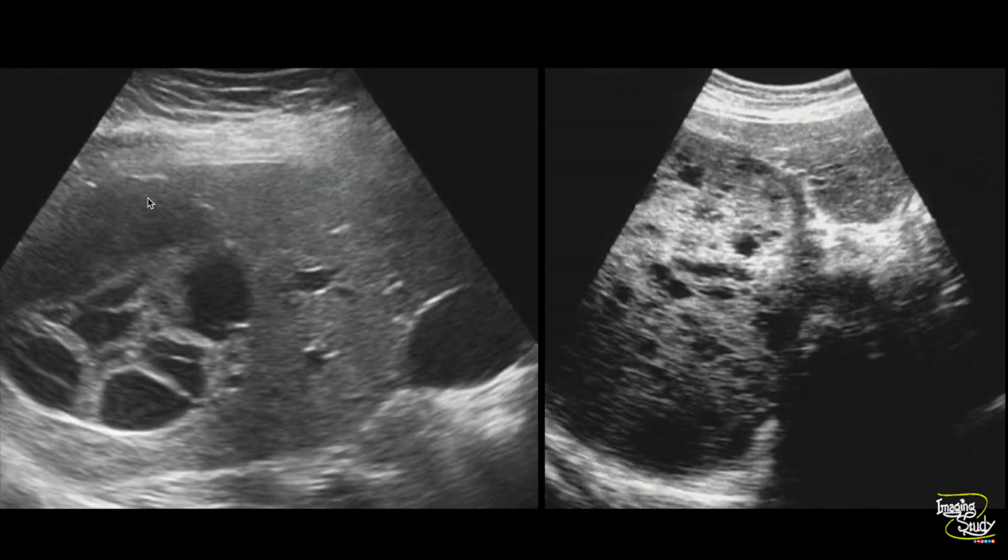If you look at the left image, the first thing that comes to your mind is the hydatid cyst. This cystic lesion shows thick septations which were not vascular on color Doppler. This picture is not available here obviously. These are diagnosed as organized thrombus within this cystic lesion.